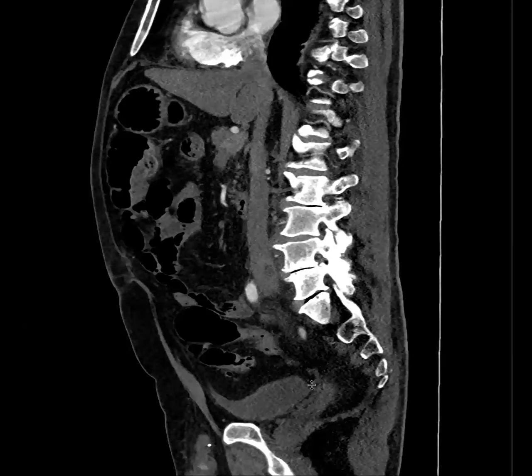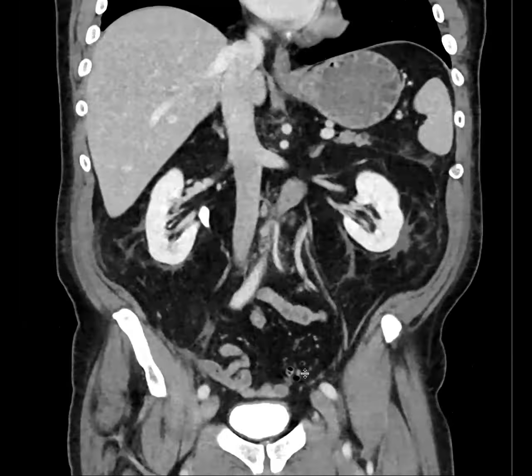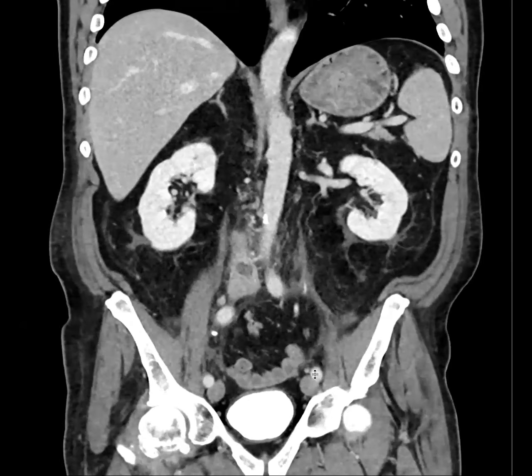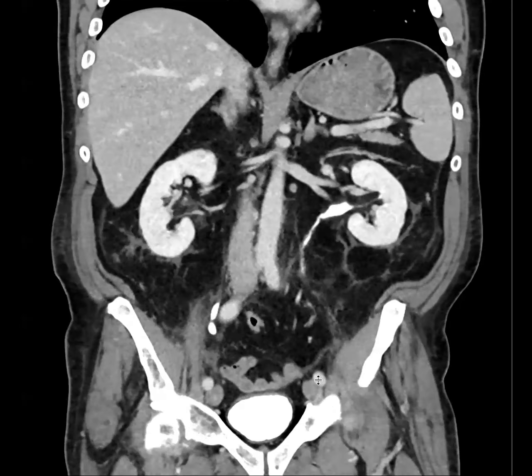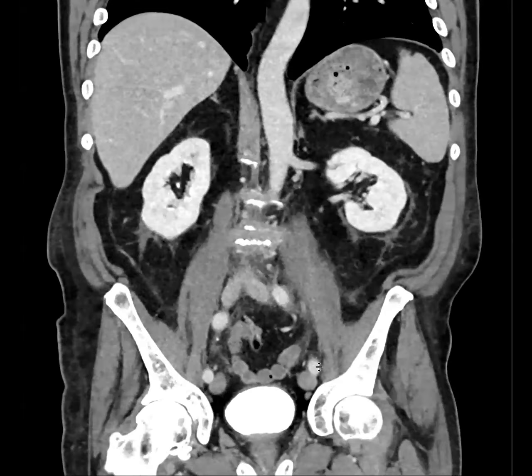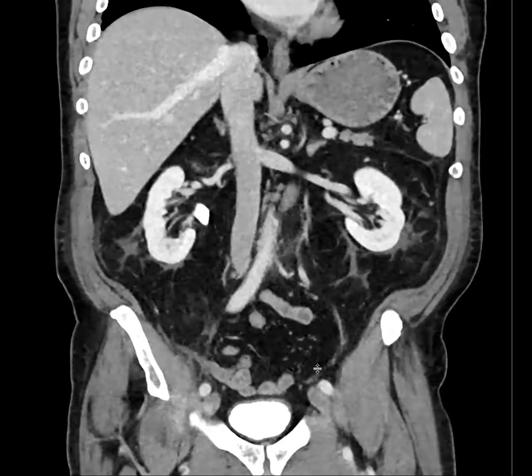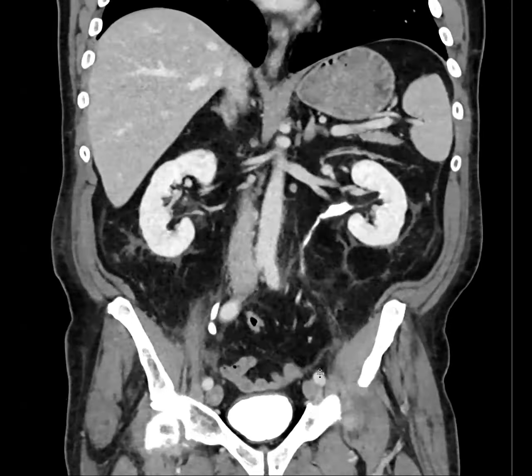Yeah, that is definitely concerning, and it also looks kind of expanded. And so is it sort of a septic thrombophlebitis? Yes, that's what's being thought, that's the working diagnosis. And the patient subsequently got a venogram to confirm that new clot in the IVC. I don't know if it's septic or just post-inflammatory clotting from all the stuff that's happening in the posterior, prevertebral space.